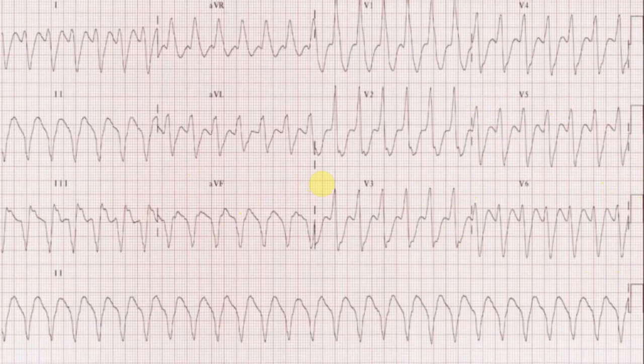This is another interesting ECG. Thank you. As always, I am going to interpret this ECG in a very systematic way. I do not want to miss the important findings. The elephant in the room in this ECG is a wide complex tachycardia. I will come back to it in a second. Let me talk you through the usual stuff at first.